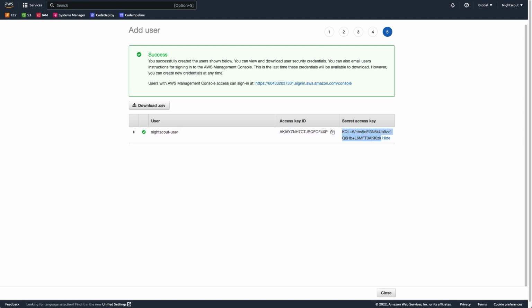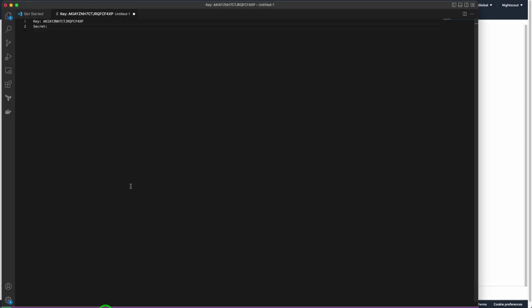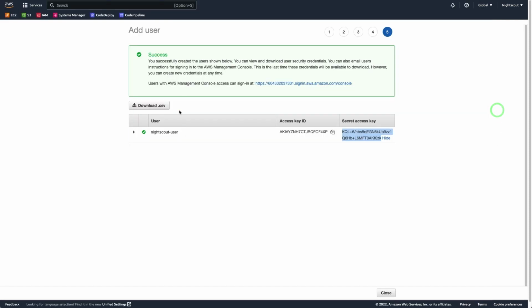Right, and I'll let everyone see that for now because it's definitely not going to exist after I record this video. But there we go. We have our key and our secret, and they are very important for what we're going to do next. But as far as setting up a user, that's all we need to do.